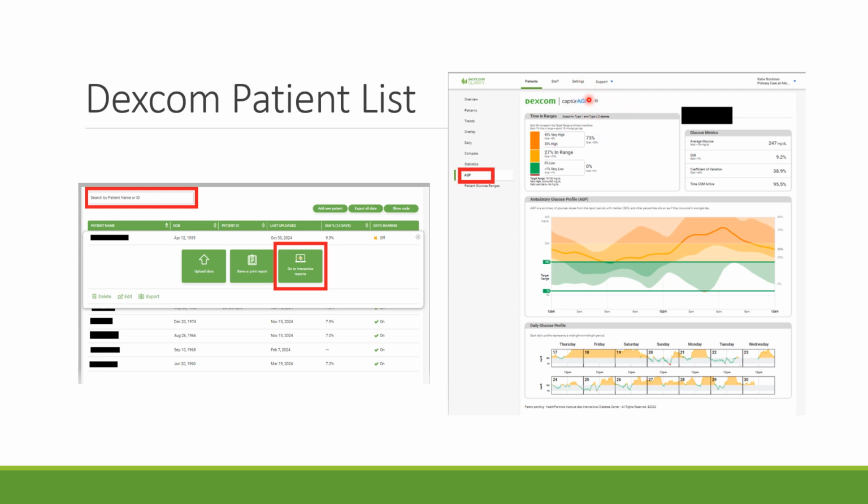So you will be again doing the entire report, which is the top part, and very important, including the date and the middle overall graph. And then here are the daily reports down here. Each square is a different day. So that gives a big overview of the last 2 weeks.